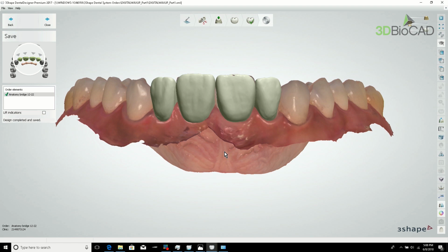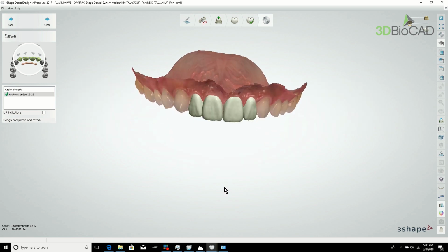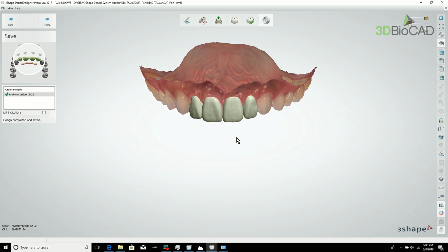So please keep in mind, this is an easy way to do the design and a quick check, a quick show to the patient. Okay, so how to make a mock-up model and how to use this as a pre-preparation will be next.